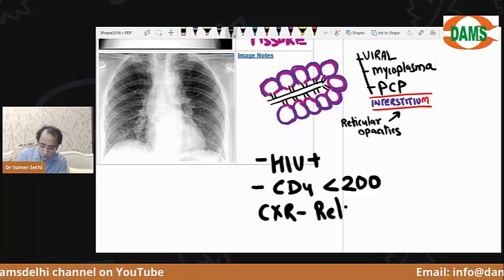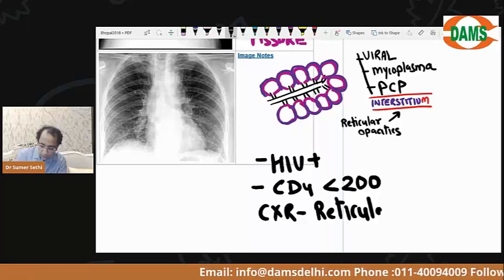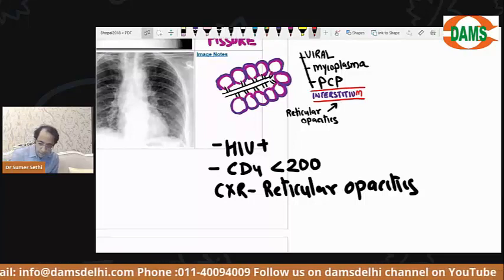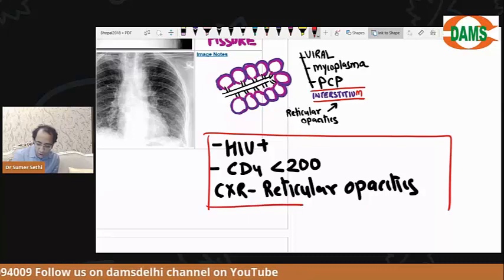This is a previous AIIMS question. What will you suspect? I will ask you the full question, but tell me, what will you suspect?